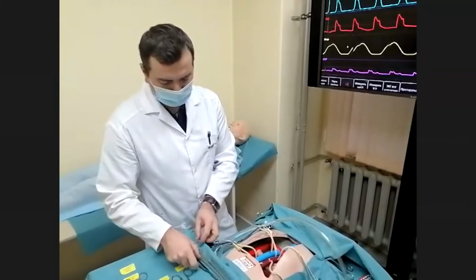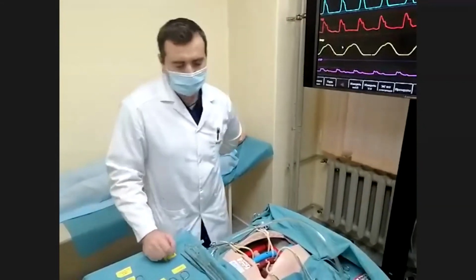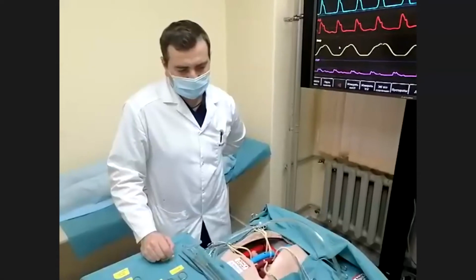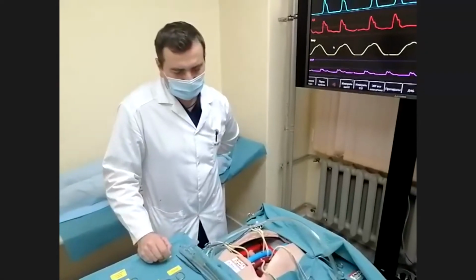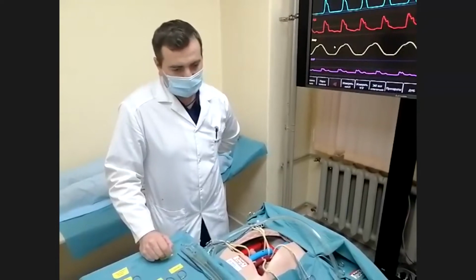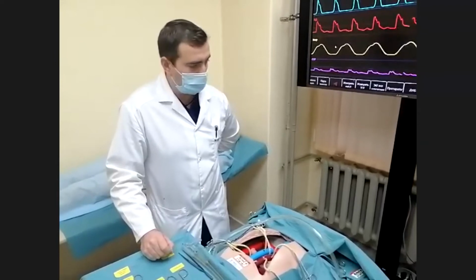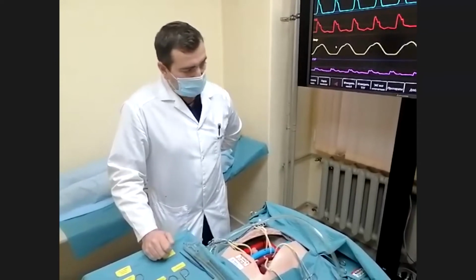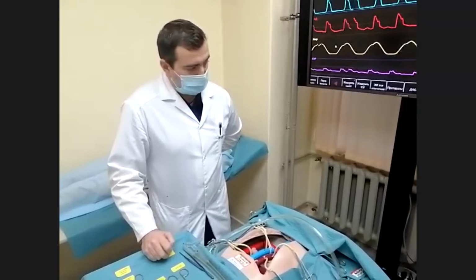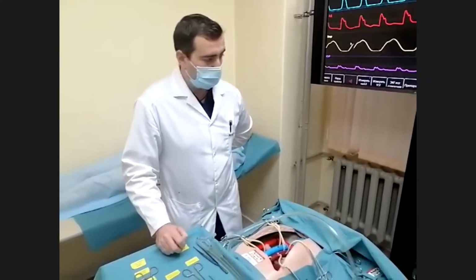Questions, please? My next question regarding the echography. Is it a different computer or the same one? Yes, it's a different computer from the simulator of transesophageal echo, the EVA dual works.